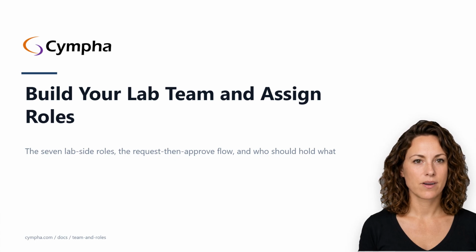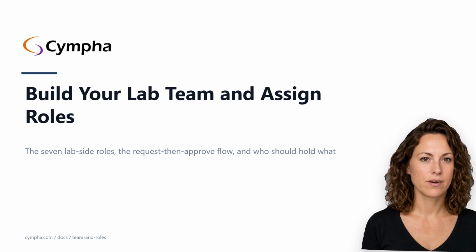By the end you'll know the 7 lab side roles Cympha defines, how a team member signs themselves up against your lab, how the pending then approved flow works on your team page, what each role sees once approved, and how to choose between the roles that look similar. Reading the written guide takes 6 to 8 minutes. Approving a real team member takes about 90 seconds. Follow along on screen, or listen now and read later.